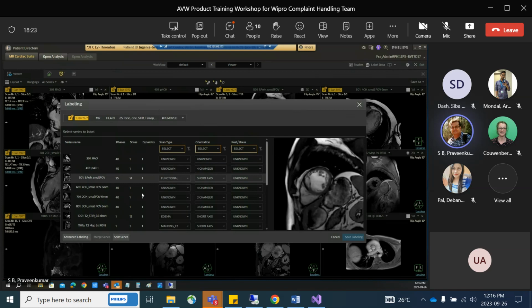Sometimes the application will not identify correctly. It may identify something else, something wrong.